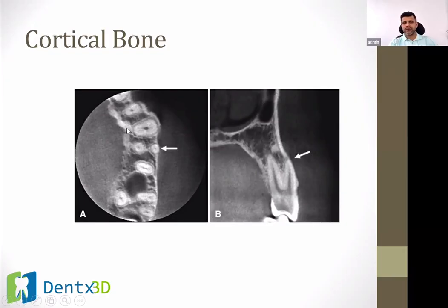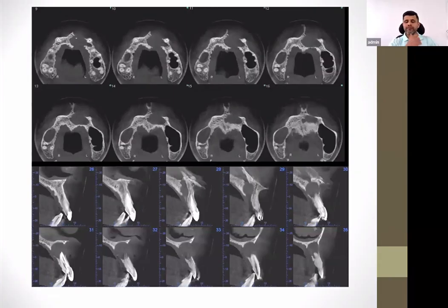Now, if you see here, the bone, you see the normal structures, how they are. There is continuity of the structures. There is this architecture of the marrow space where you see radiolucent and radiopaque lines going through it. Right. So this is how normal bone looks. Why am I saying this? Only when we know the normal, we will come to know the abnormal.